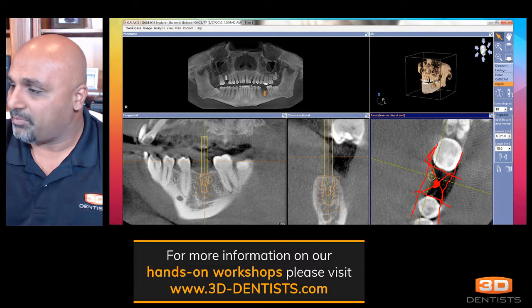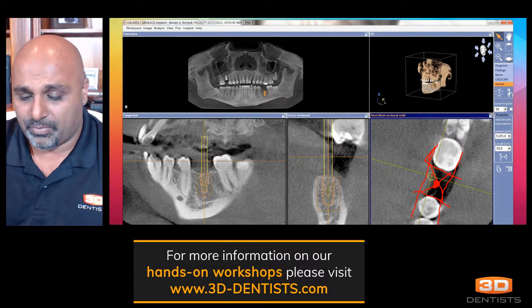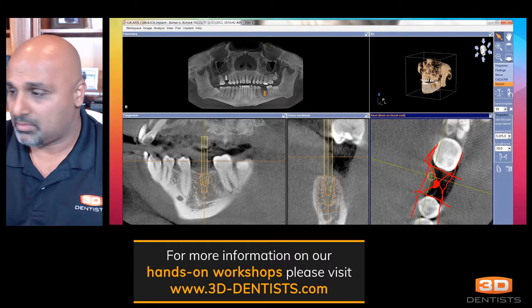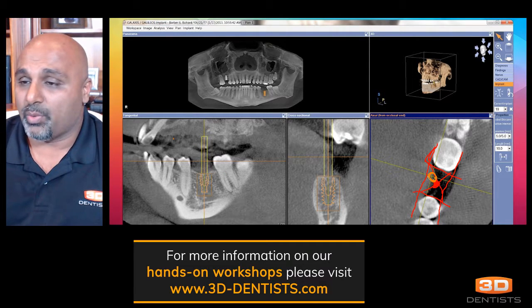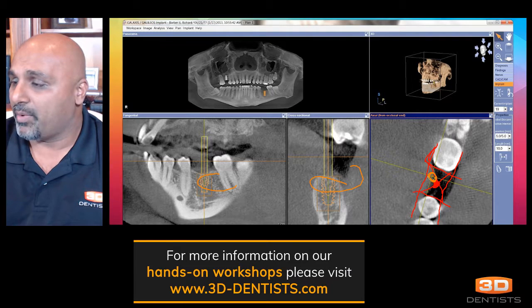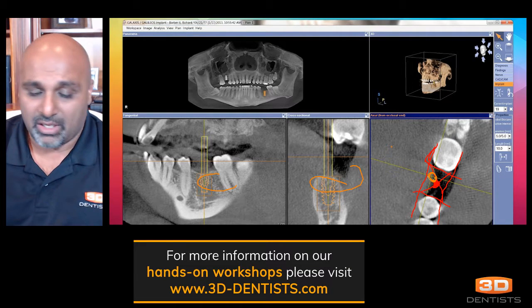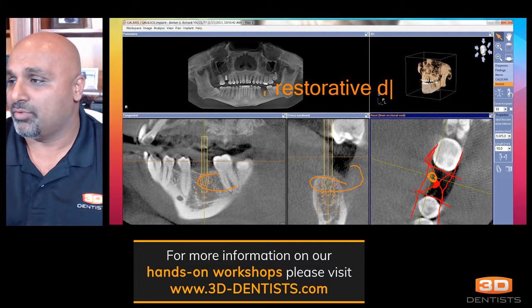So we want to kind of be right in here. So in here what we can see is that our implant is planned over here. So we want to keep in mind all three dimensions. We want to look at it from the mesiodistal right here. We want to look at it in buccal lingual here in the center, and we want to look at the restorative position right here. Because after all, we are doing restorative driven implant placement.